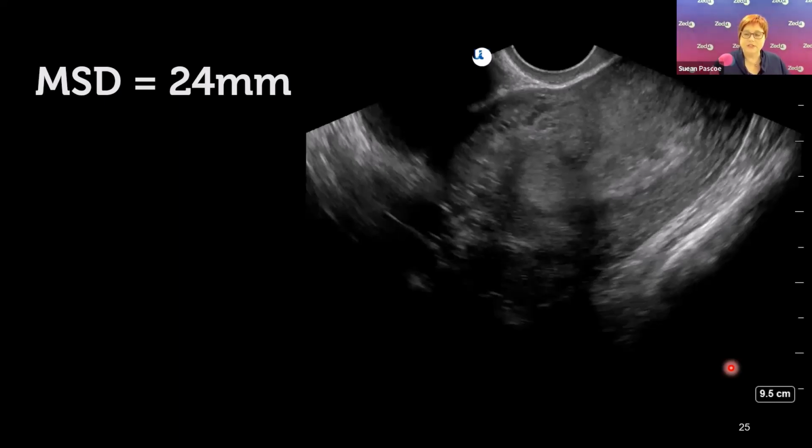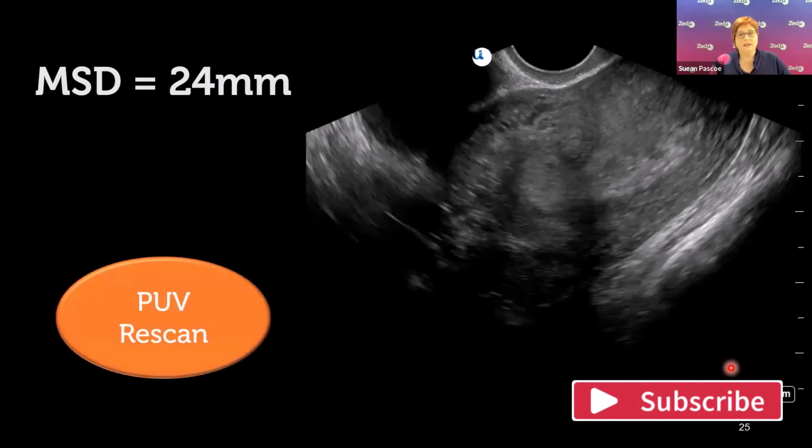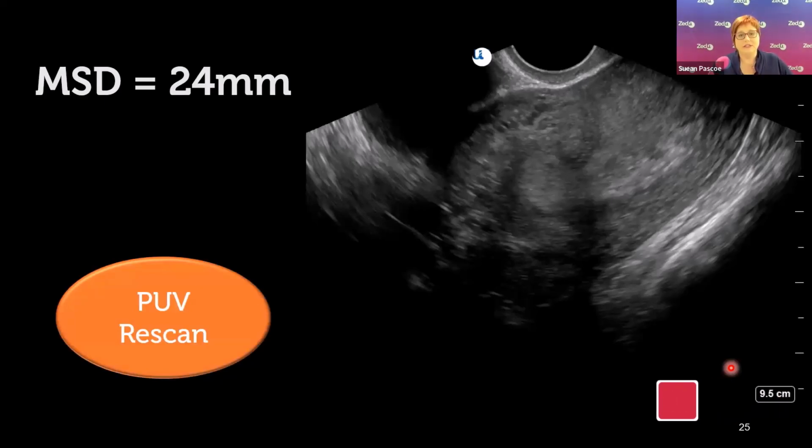So remember, the gestational sac grows by about 1 millimetre per day in early pregnancy. And so the repeat scan should show growth commensurate with how much time you've left. So we need to be careful to make sure enough time has elapsed so that when we rescan, we are getting an answer. In the meantime, you could do beta HCG and see if they're tracking normally as well.